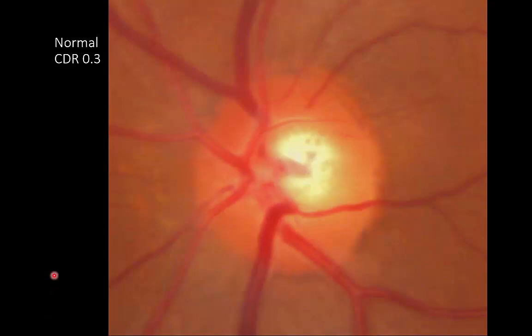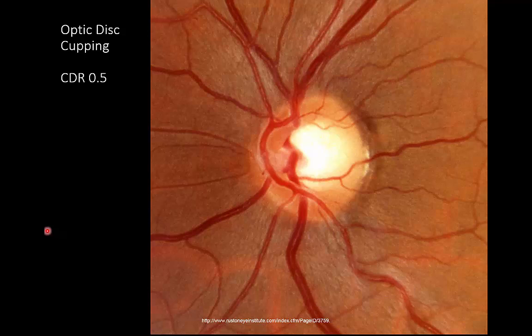So let's look at a normal optic nerve and a normal optic cup. So here is our optic disc, and if we measure the distance here, and here's our optic cup, and if we measure the distance here, and we figure out the ratio, in this particular case the ratio is 0.3. This is a completely normal cup to disc ratio. Let's contrast it to another case. This is a case where there's some optic disc cupping, and the cup to disc ratio is enlarged. So again, think about the entire width of the disc and now the width of the cup. It's much bigger. Indeed, when you measure this, this is 0.5. This would be very concerning that the patient has glaucoma.